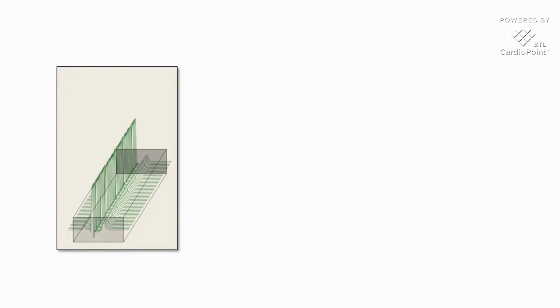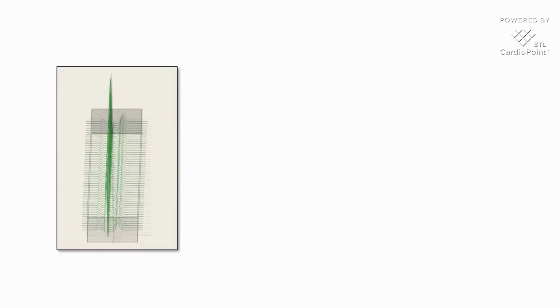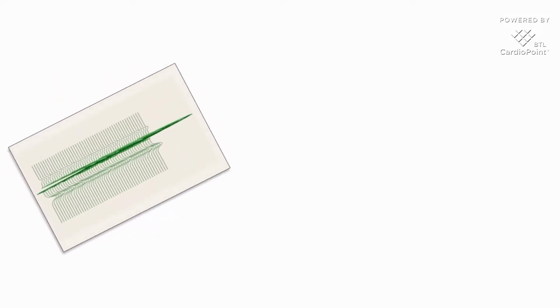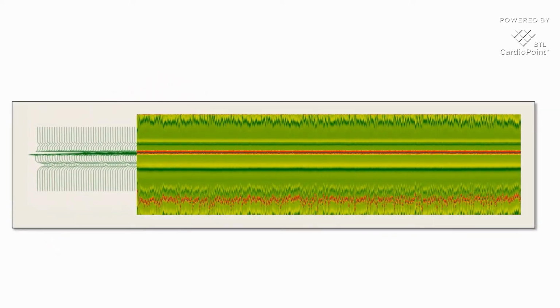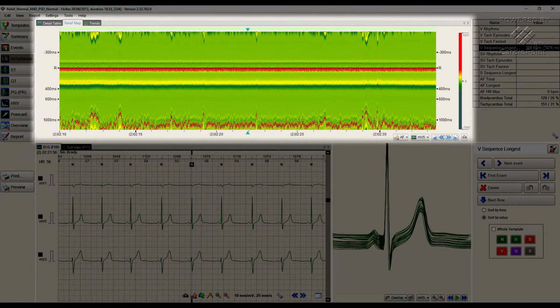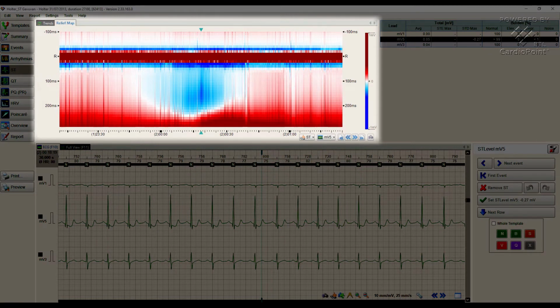This tool serves for visual ECG analysis and significantly saves time when working with a signal. Instead of reviewing the recording beat by beat, we see hundreds of beats at once, with clearly visible P waves, T waves, and QRS complexes. It is the optimal method for tracking waveform changes, such as arrhythmia, atrial fibrillation or flutter, ST depression or elevation. The tool has 2 modes: AF mode for arrhythmia diagnostics and ST mode for ischemia diagnostics.